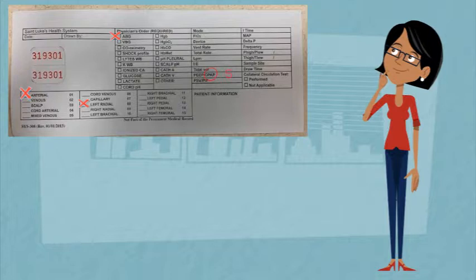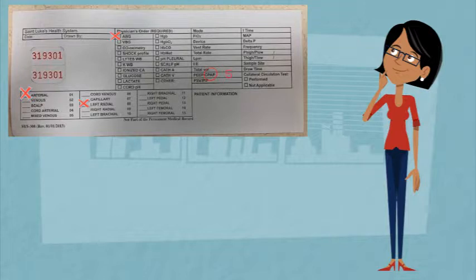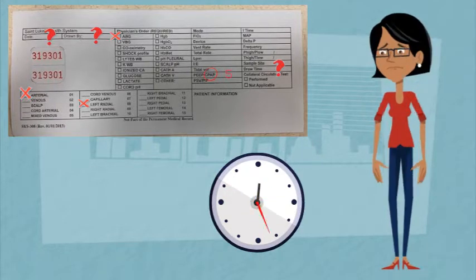Previously, a paper requisition was used with written documentation of information like location of ABG stick, oxygen delivery method, and even ventilator settings. All the information filled out shows up on the final results and provides a clear picture of the patient while on specific oxygen therapies. Often, there was a delay with resulting ABGs due to inconsistencies in filling out the requisition.